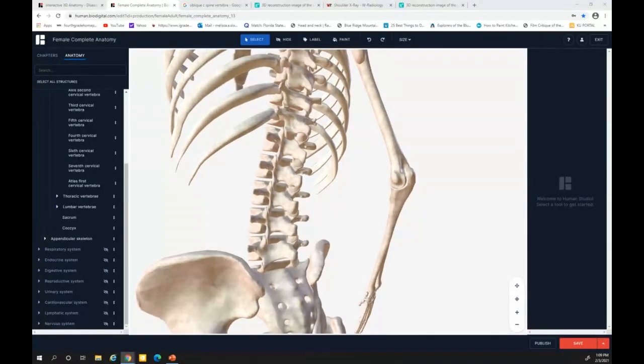All right, I just wanted to share this with you for the rotation of the lumbar spine. What I wanted to do, I need to do it in an anterior oblique so that we can see the Scottie dog of interest. Because of the way that the model is built, it's just easier to see it in an anterior oblique.